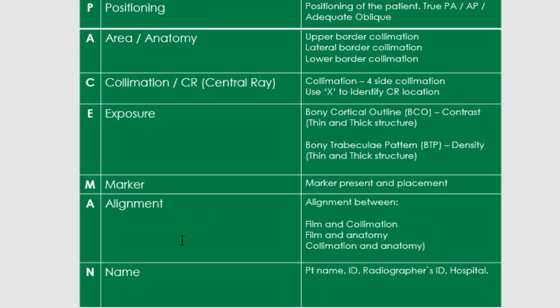Okay. Marker, placement and present in appropriate place. Okay, alignment between film and collimation, film and anatomy, and collimation and anatomy must be present like this. Then name, patient name, ID, radiographer's ID, and hospital should be present.